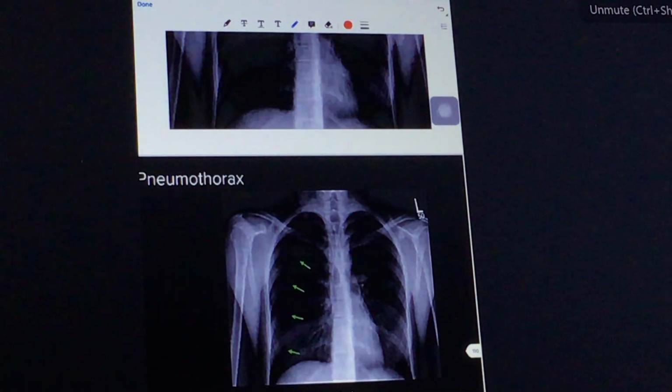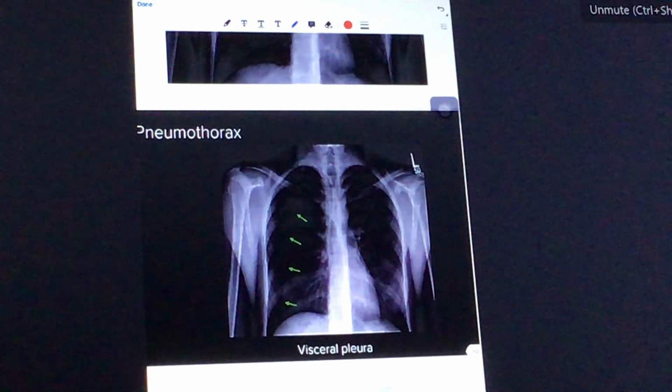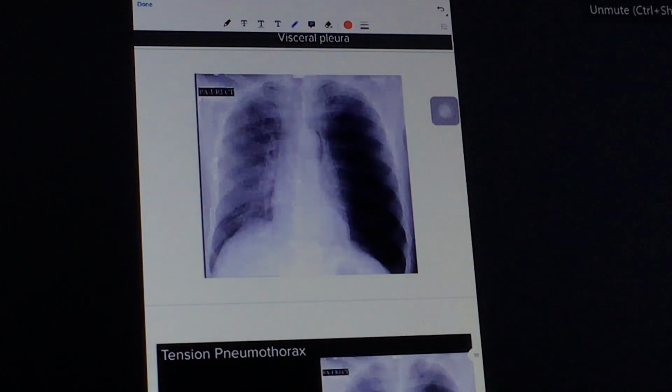What about this one? The pneumothorax is on the left lung, where the heart is supposed to be in this position, but it pushes, so it shifts the structure away. The trachea is not really visualized. It's usually pushed away to the right side.